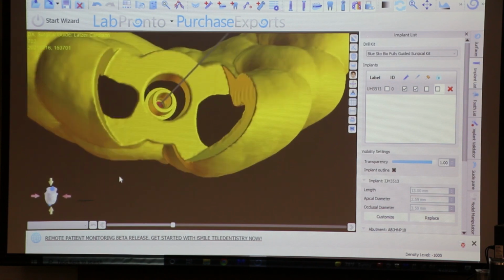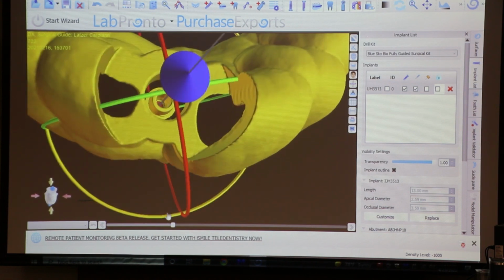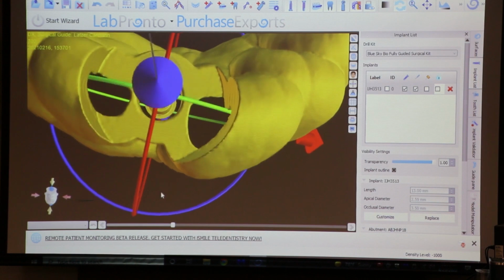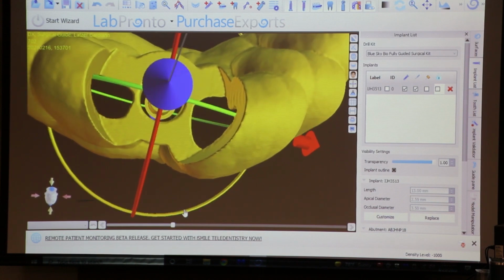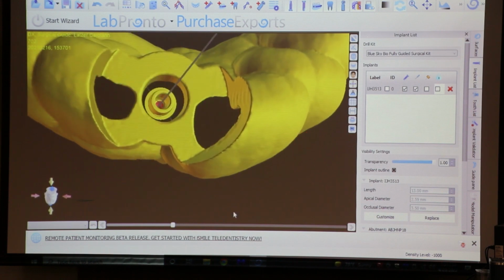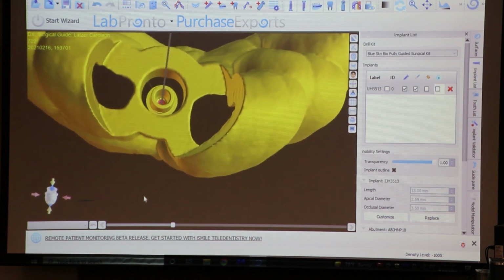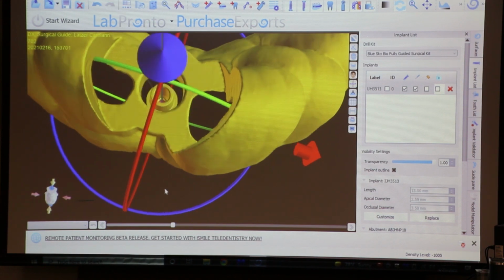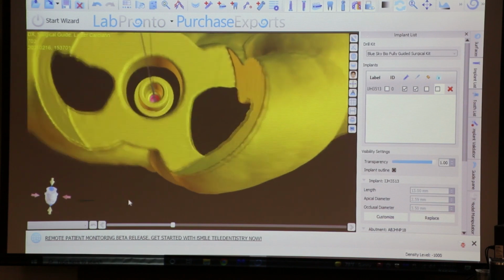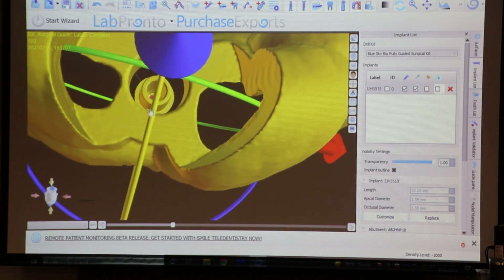So I could actually, at this point, spin that so it's straight buccal. Now what this allows you to do is, if you didn't mark the timing, but you just wanted to know, like, hey, I just need to put a flat spot straight buccal, you can actually do it at this phase, put your marker flat buccal right there.